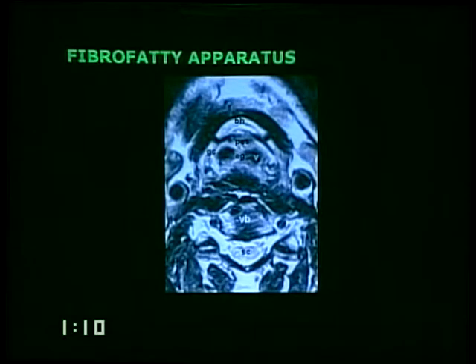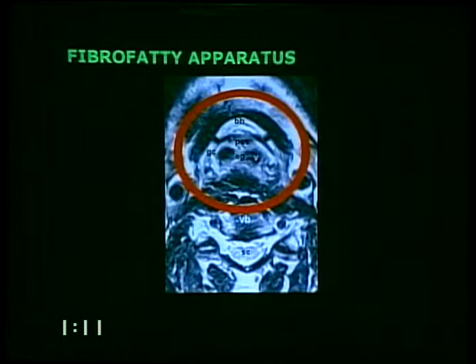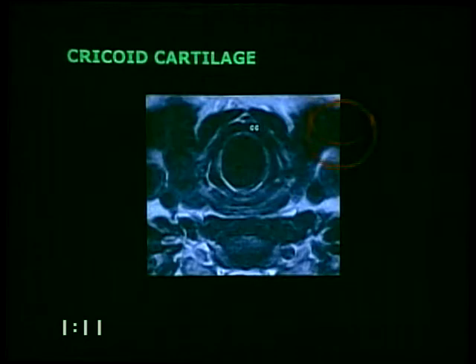upgraded. If you don't do a lot of laryngeal cancer staging at your institution, then just remember to look at the fat around it. Just describe which locations the ENT surgeons call these stations. Just tell them which stations the fat has been violated in, and they can accordingly upstage and upgrade their tumors. But it's very important to look at the fat around the cartilage.